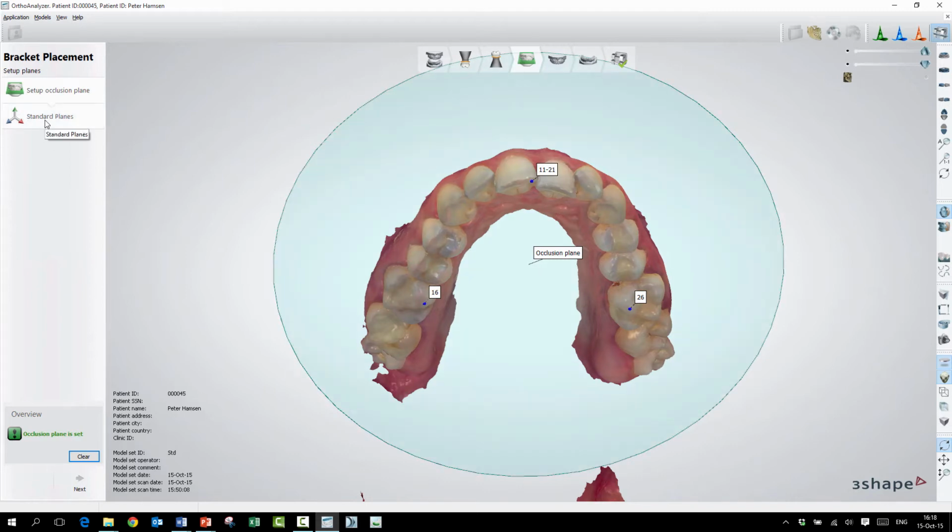Yeah, so basically the first 4 of those 7 steps in the workflow bar on the top of the screen are familiar territory for someone that knows the analyzer. Yeah. But they're just being used for this specific purpose. Exactly. It makes sense in that context.